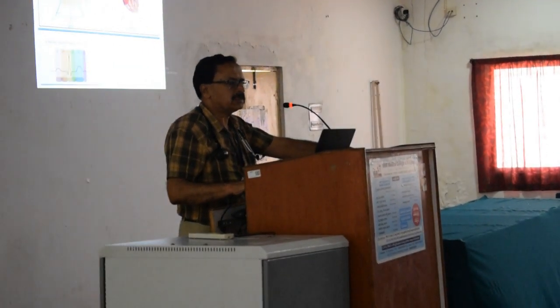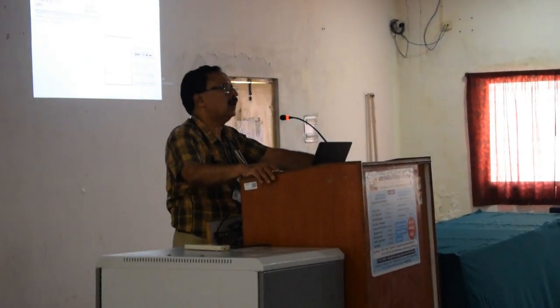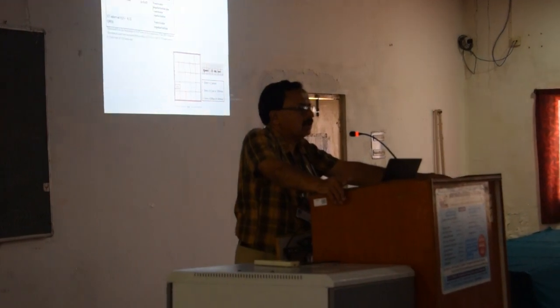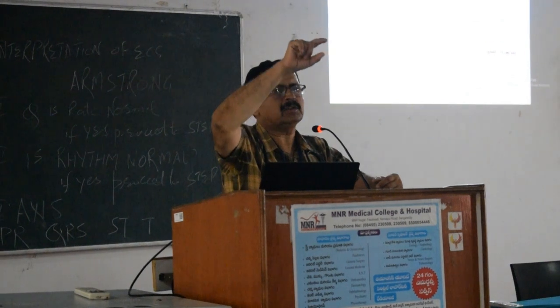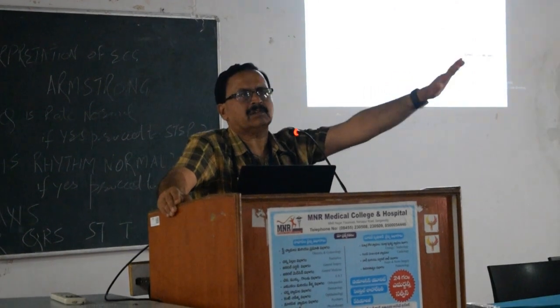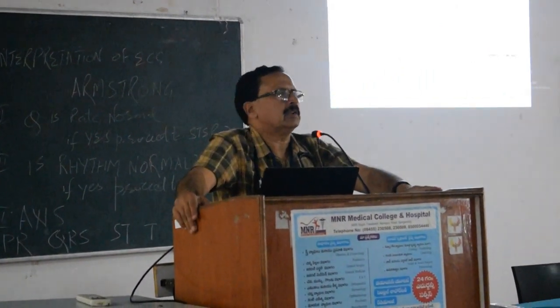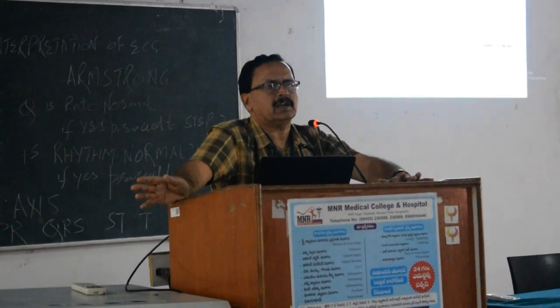And then of course this is the spatial orientation of the ECG leads, and therefore some intervals we talk about. In the reference you can see the blackboard I have mentioned. The first is the PR interval. The PR interval, normal. There is a facility to freeze the screen. You can then count the number of boxes, that will give you the heart rate. Again it is immaterial whether it is regular or irregular because we are counting from the number of seconds. So you will be able to calculate the heart rate, whether it is the RR or the PP, if you want to measure the rate.